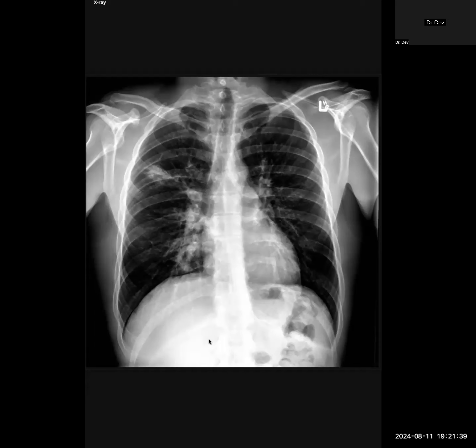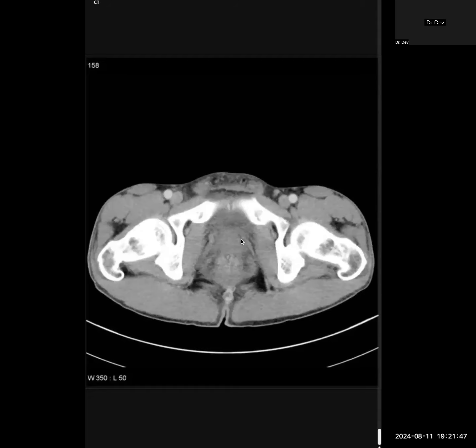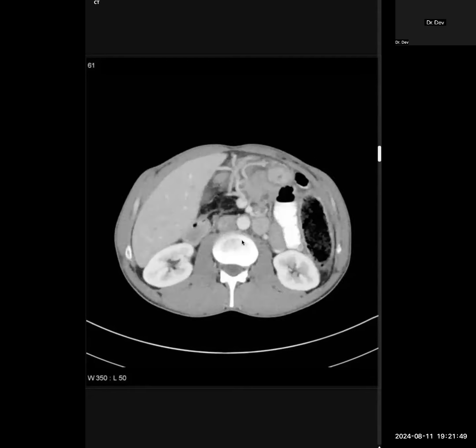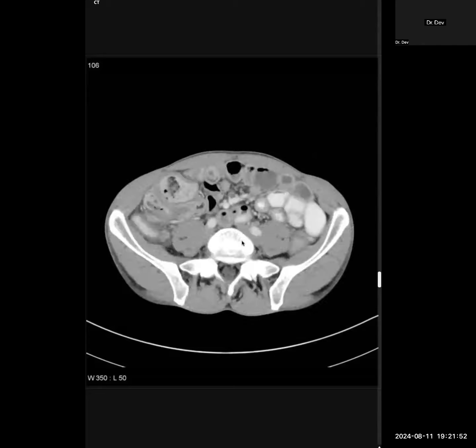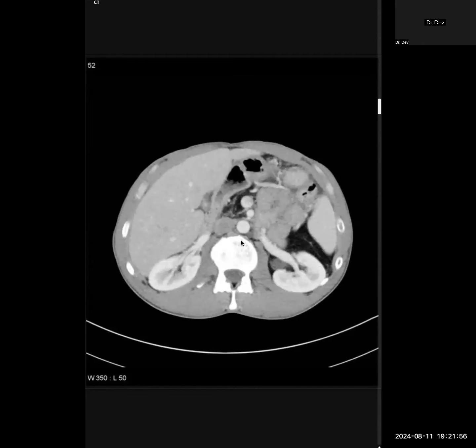But again, since you got the diagnosis, you went with infective. This was a 6, and then with the second modality, I would have given you a 6.5 or a 7 with this because you got all the findings. But as with any intestinal obstruction, you have to mention that this is an emergency and I am going to quickly inform the surgery team.